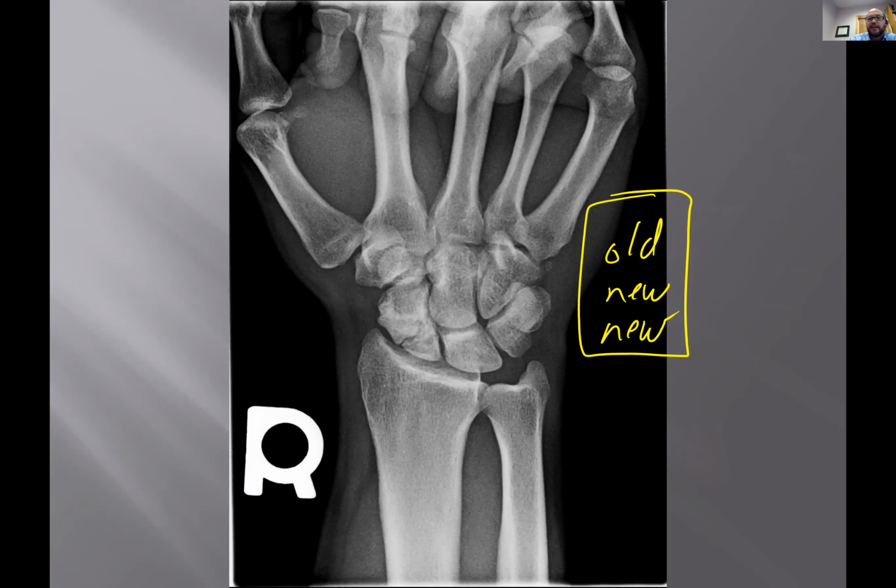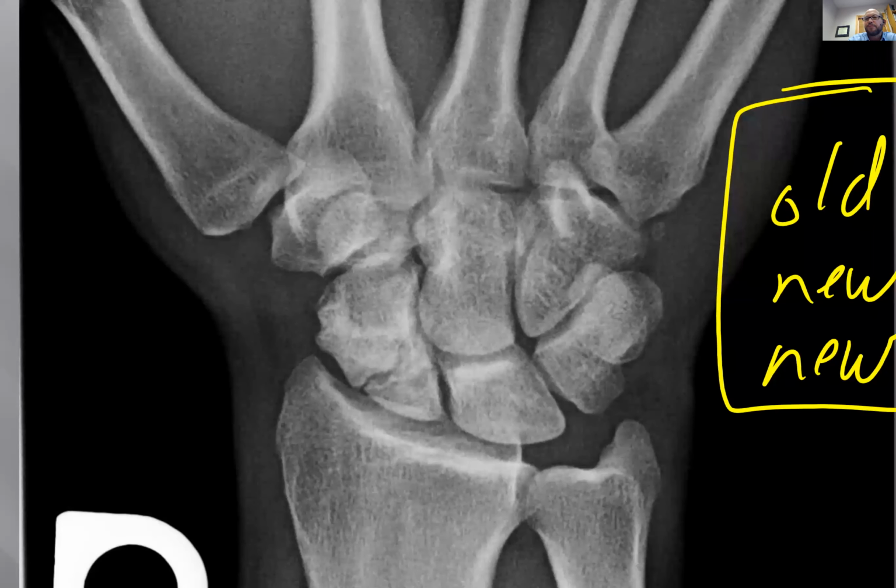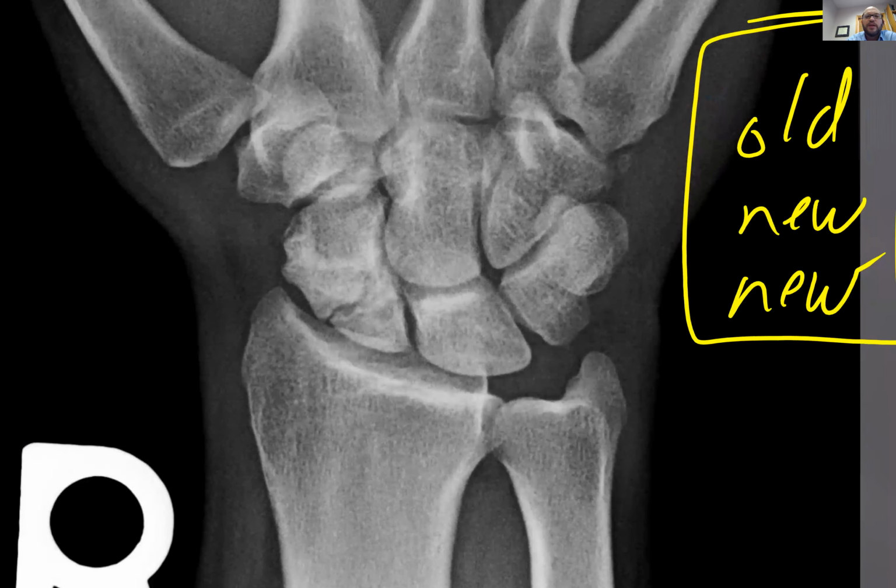Let me go back. All right. So if I'm looking at this fracture site, notice at the fracture site, can you guys see that little white hand there? Yep. Okay, good. Sometimes I just gotta make sure. So, rubbing the fracture site here, and that fracture site, if you look at the margins, it's got a sclerotic rim around those fracture margins.